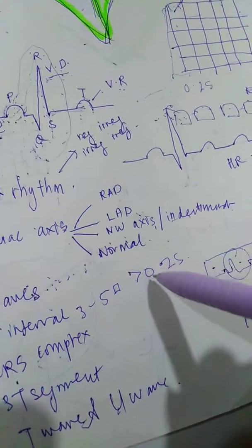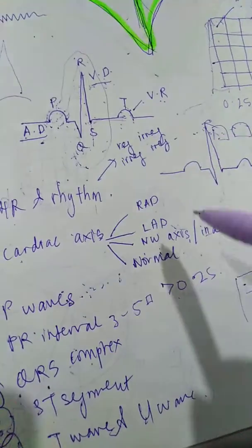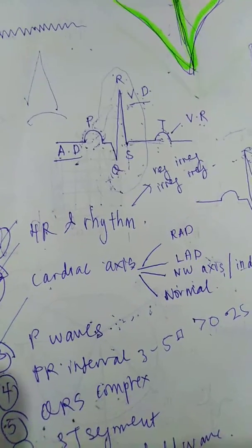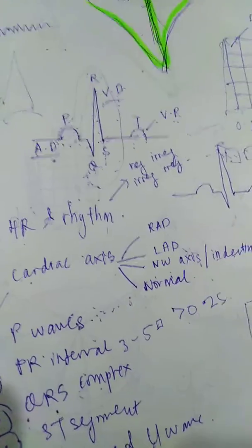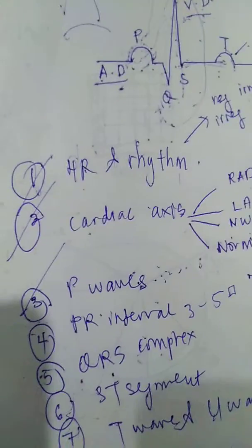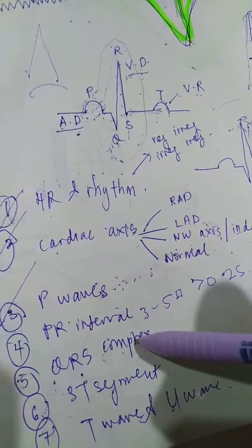If a patient has a prolonged PR interval, it means there is a block after your AV node, which means there's an atrioventricular delay. As I told you, SA to AV node, but there's actually a block over this area. Your atria have already contracted, but before it reaches your ventricles to start contracting, there is a block, there's a delay.